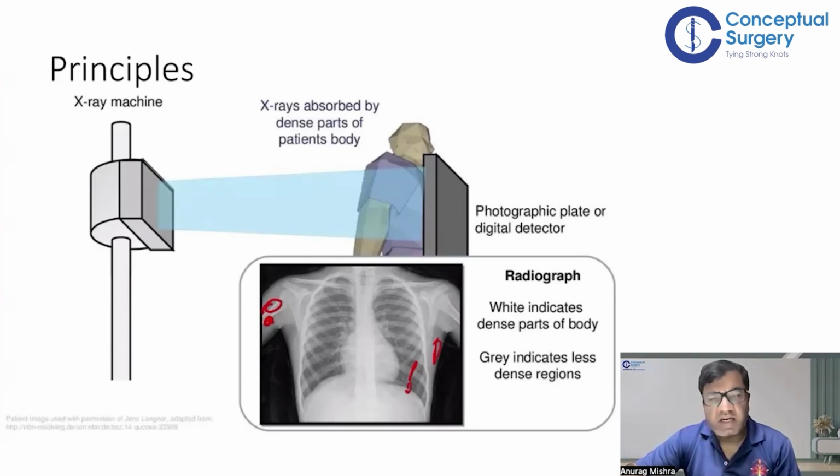If I'm seeing something like this in a rounded cavity, maybe in the abdomen or in the chest, I can say there's something dense-walled, but with a kind of semi-solid substance in between. So maybe I can start thinking about what it can be, maybe an abscess, a chronic abscess or a tubercular abscess. That is how I'll be able to have some differentials in my mind, seeing that X-ray.